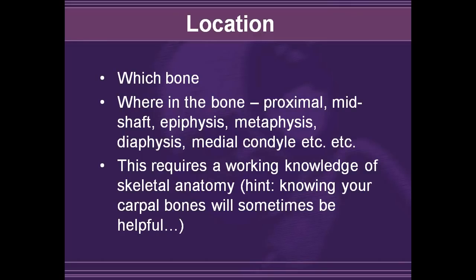In terms of location, the first thing to describe is which bone is involved. Is it the proximal, mid, or distal portion of the diaphysis? Is the epiphysis, the distal end, involved, or is there involvement of the metaphysis? Condyles are also important to describe. All of these descriptions do require some working knowledge of skeletal anatomy, so knowing which bones are around is important, and particularly things like the carpal bones as well as the bones in the foot.